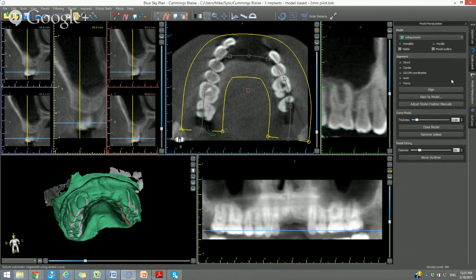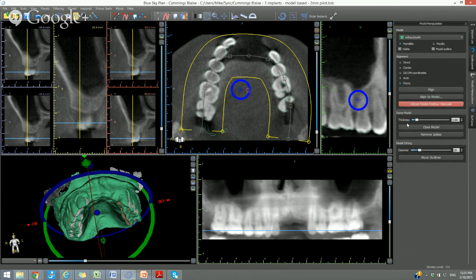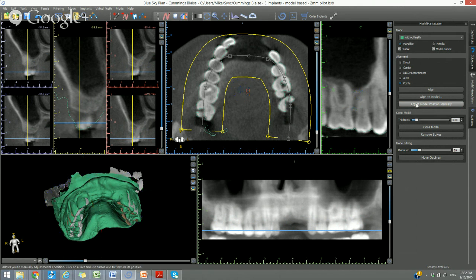There's more functionality. You're able to adjust it manually. You're able to adjust it using a widget, change the points of rotation. You're even able to adjust it almost pixel by pixel using the arrows on your keyboard. We're not going to go into these functionalities now, but you should know they exist. And if you like, you could watch a video about them, or you could contact me and we could go over them. But the general protocol is to use the points, use a line, disperse the points, place them as accurately as possible, and the alignment will be successful.